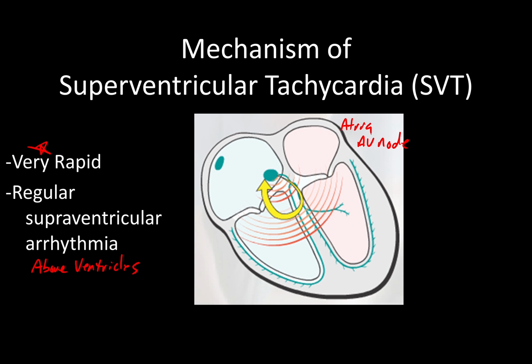That really doesn't tell you a lot, though, does it? It just says that, hey, it's above this area, and that's the most I can say. It's not an accurate description, and the reason we use this is because P waves usually aren't visible. That's the big part that helps lead us to this.